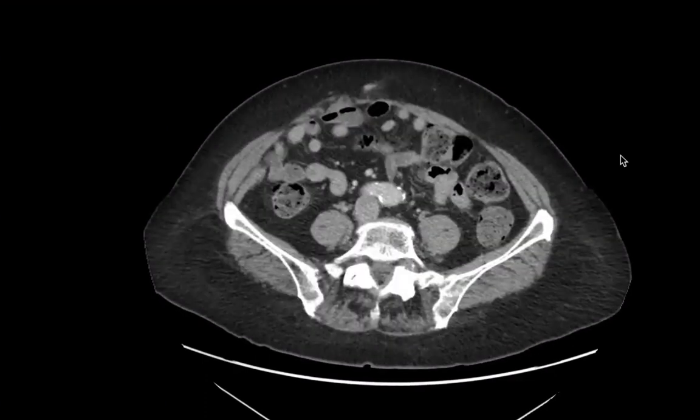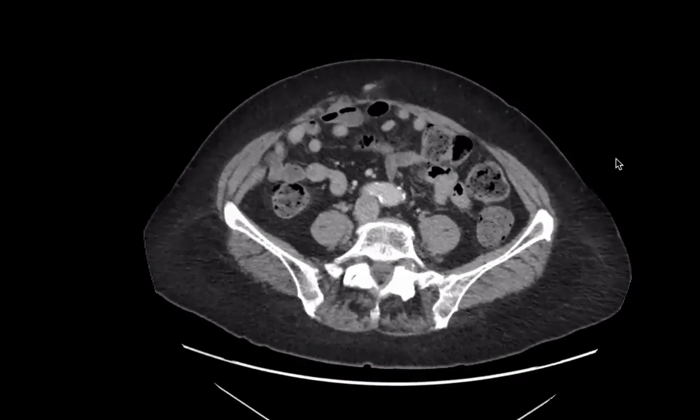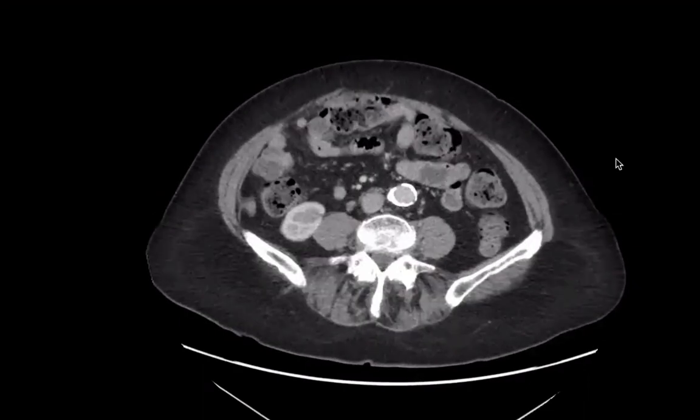What is your approach, and what will you do if this happens to you in the exam? I will check first the solid organs, then I will follow the colon. I will look at the hernia orifices. You said you will look at hernia orifices and the colon, and what else? But don't tell me the findings. Okay, I will also check the abdominal vasculature. I will look for abdominal lymph nodes, the paraspinal regions, the spine and the pelvic bones, and fat stranding in the mesentery.